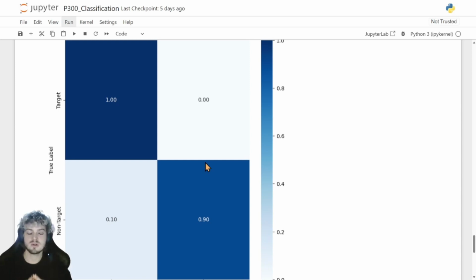If you want to use deep neural networks, you're going to need way more data than what I provide. So you can also do that. You can record your own data set and start from here and then apply a deep neural network. In that case, probably you should also use some library like PyTorch or TensorFlow, something more sophisticated than Scikit-learn. But if you're getting started, I think you have all the necessary here.